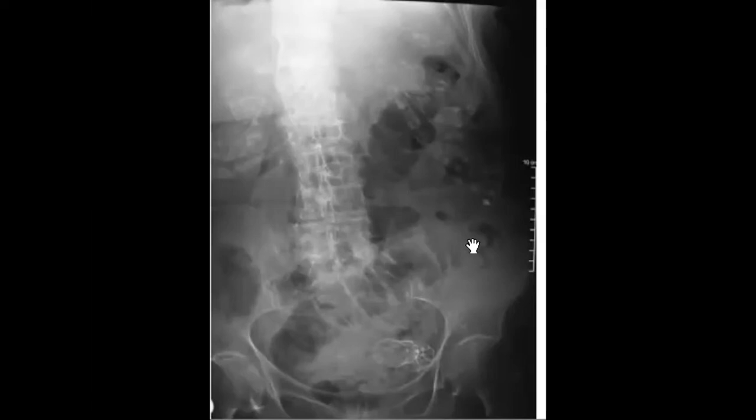So anyway, in the FRCR, they like you to mention that this case will probably need to be discussed urgently with the surgical team, to see if there is any perforation or any migration. That's nice thinking, especially with the history of the esophageal stent.